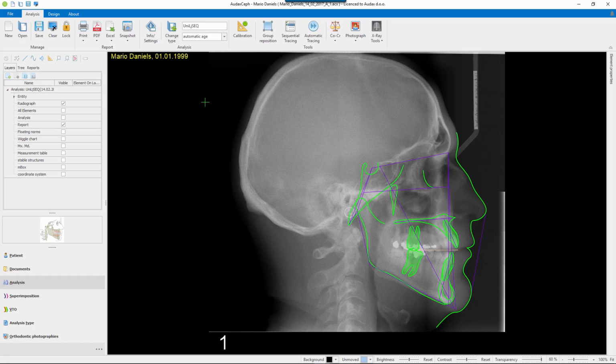The majority of work is not superimposing itself, but rather to find, recognize and trace these structures correctly. Bad radiograph image is a killer to the process, so forget about tracing or doing structural superimpositions if you need to guess those structures. I give a credit for the knowledge to the book titled Cephalometric Superimposition by Planchet and Dutelot, and to American Board of Orthodontics for various freely available publications.